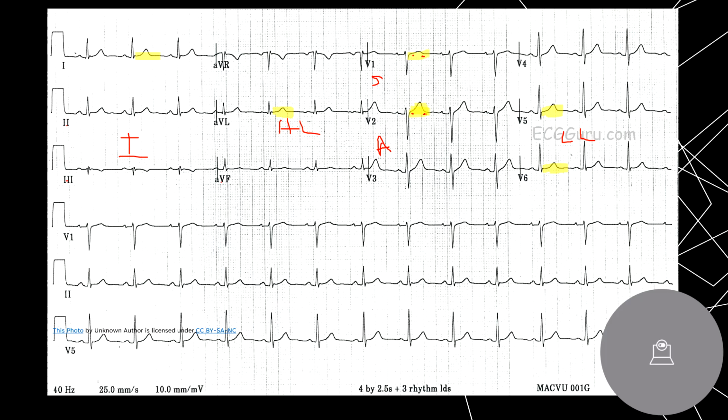Okay, look at these guys. So here you have, this is your T wave. Let me just bring out the T wave in lead 3. Lead 2 looks okay. That's pretty flat, right? This guy right here, that's your T wave. Look at your T waves here. They're inverted. Okay, so that could be significant. That could be signs of ischemia.